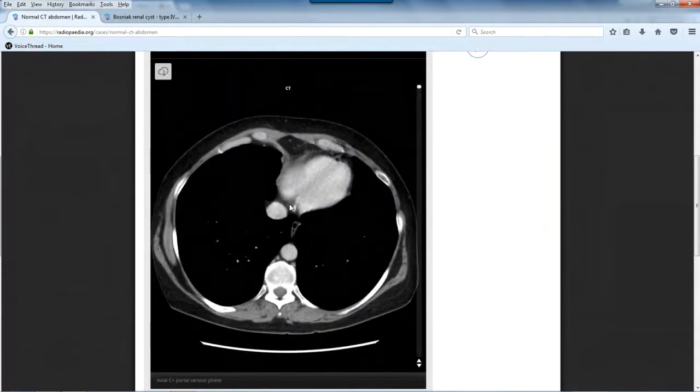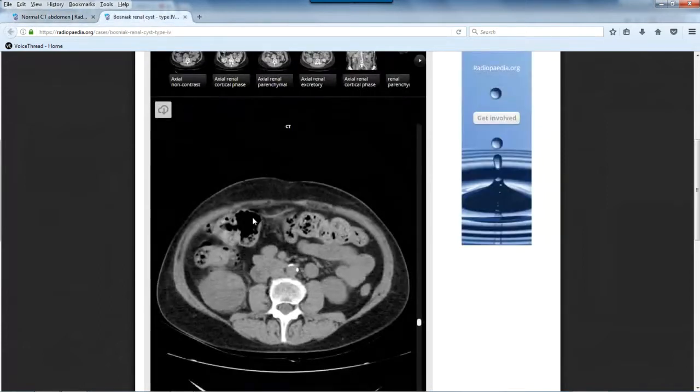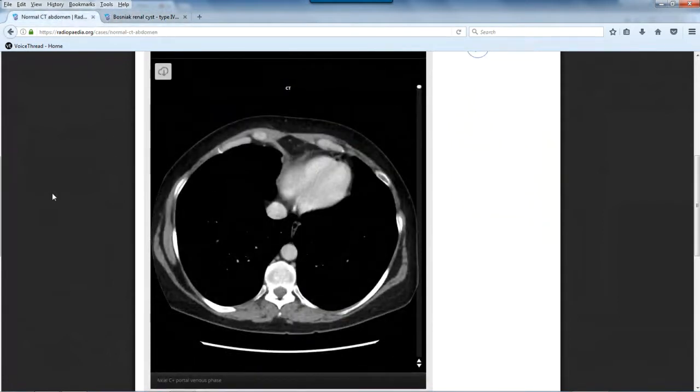And again, remember the links to these two CAT scans, the normal CT of the abdomen and this next one, which I'm going to reference for the CTA of the abdomen. Both of those links are in the course under normal CT of the abdomen and then CTA of the abdomen. So again, refer to these to study from. So, okay, starting with this one, this is the normal CT of the abdomen. Let's start all the way at the top.